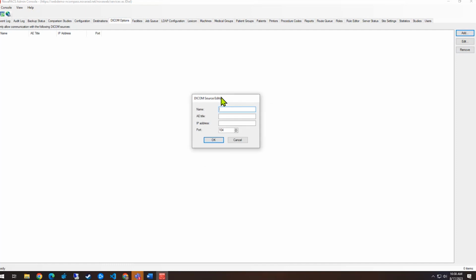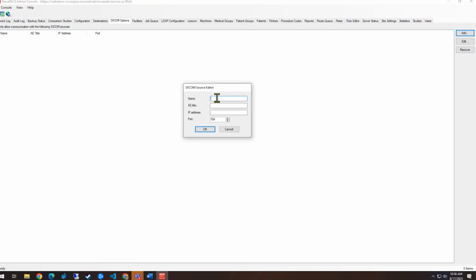So you'll just come in here, go ahead and name it. This name is just whatever makes sense to you. The AE title, this is the AE title of the requesting system. So that when it reaches us, it's going to say, hey, I am this AE title from this IP address, and I'm requesting from this port. And if those match, we'll go ahead and say, okay, you are authorized to query retrieve our system. Here is your information. And that takes us into the event log.